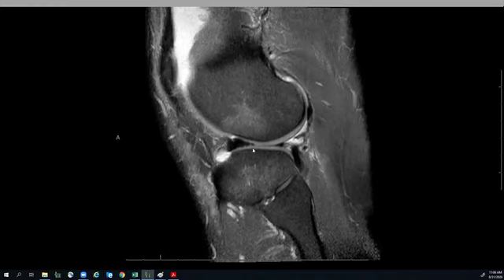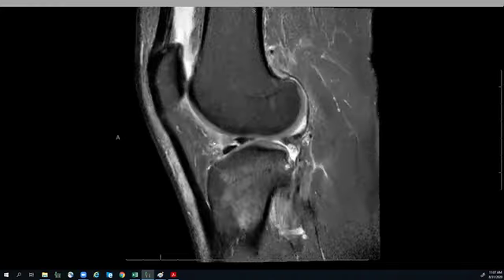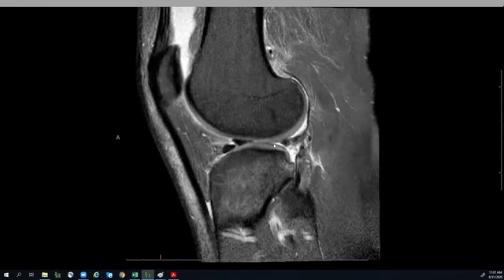With the exception of that, postoperative changes are always going to look somewhat like a linear gray area, and I think you just need a time-wise approach to diagnosis. To a certain extent, you need serial images, and you need to see if the tear is occurring in a new location relative to the old tear, and take that type of approach. I think in some cases it might be difficult. Mucoid degeneration technically doesn't surface.